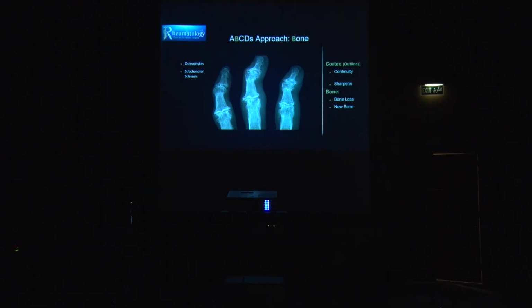Clinically, this extra bone will be seen as Heberden and Bouchard nodes of osteoarthritis. So I see nodes on both sides of the joint, like small little lumps on the side. It's called Heberden's and Bouchard's because of the osteophytes. So these are examples of new bone formation, because as I told you, in osteoarthritis the bone will try to repair the damage by making more bone.